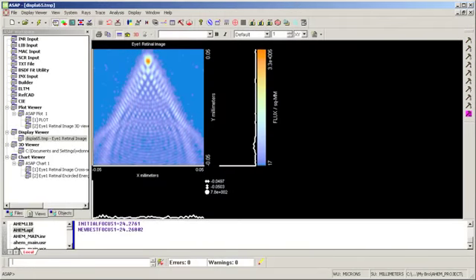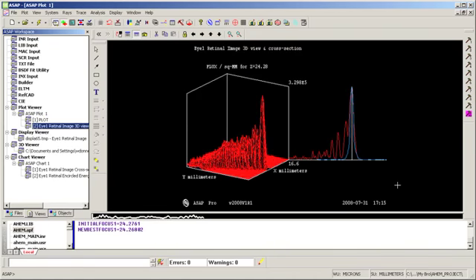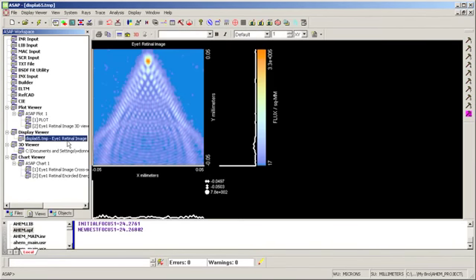We're now going to use the eye model to look at aberrations through a field or through depth. So here we're looking at the aberration coma that we've put on the cornea of the eye. So we're looking at the image plane right here. So some aberration has been put on the cornea. Light has traveled into the eye. Here's a cross-section of that coma and an isometric view. And the display once again.